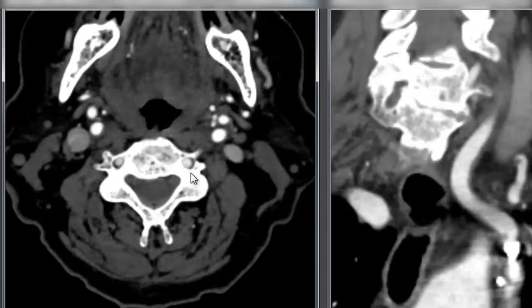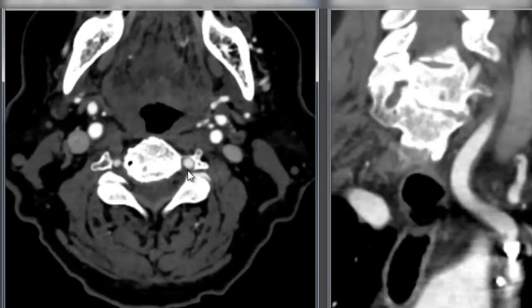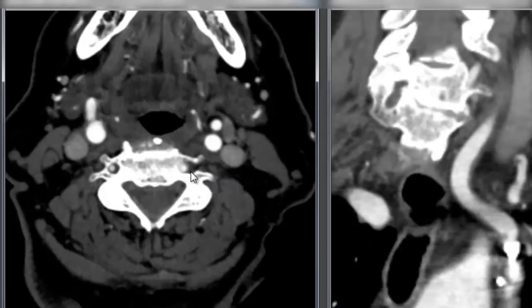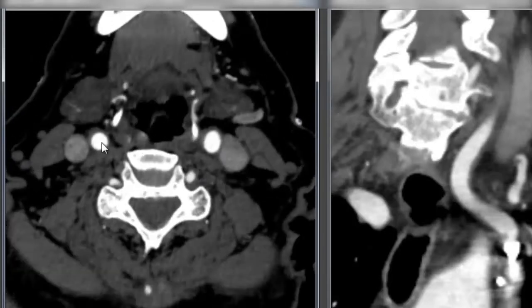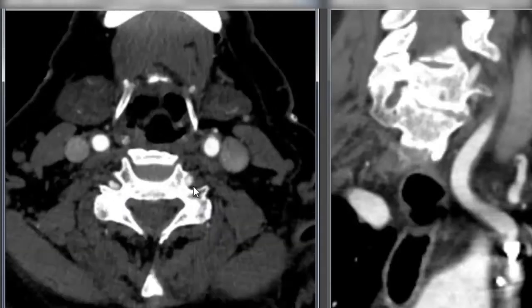We're going to focus on the dominant left, but you can see on both sides the vertebral artery is now passing through the transverse foramen of the cervical vertebral bodies, and we come back down here, and then we see we're now at the level of the common carotid artery on each side. So this is a good way of orienting ourselves. We have the right common, right vertebral, left vertebral.